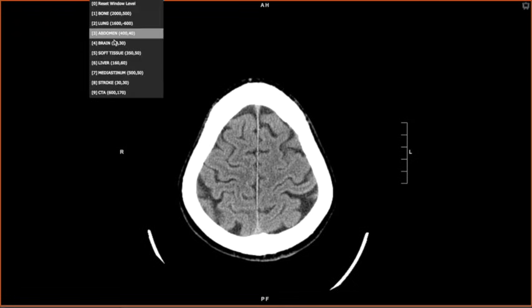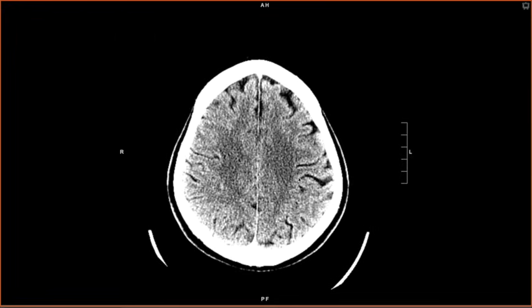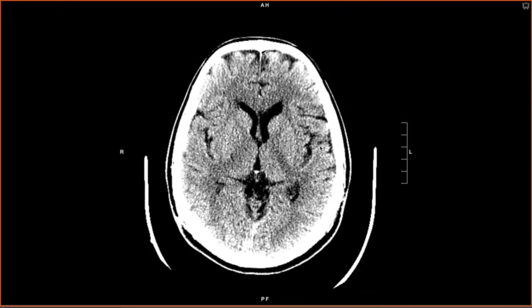The gray matter structures you're going to need to know are as follows. I windowed it differently so that they pop a little bit more. Firstly, within each of the lobes, there is cortex, or the outer portion is made up of mainly gray matter. For example, this here in the frontal lobe is all part of the frontal cortex. This is a gray matter structure. Then you're going to need to know the deep gray matter structures as well.